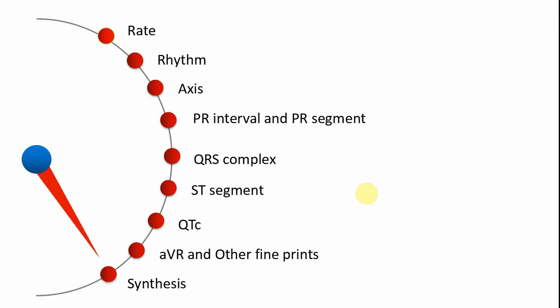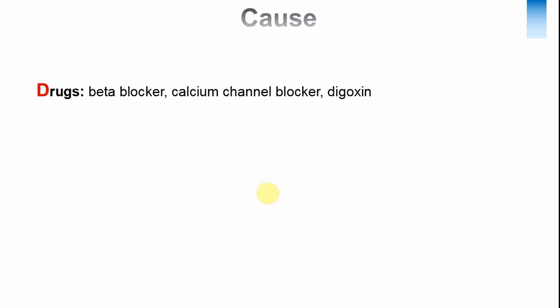Awesome. Really interesting. Yeah, so looking at the ECG in a very systematic way can be very interesting, and it is very informative. It can give us a lot of information. Now very quickly, some of the causes of the complete heart block, why it is happening and what we can do about it. Now there is a mnemonic, probably you have heard about it, DIMES, D-I-M-E-S.